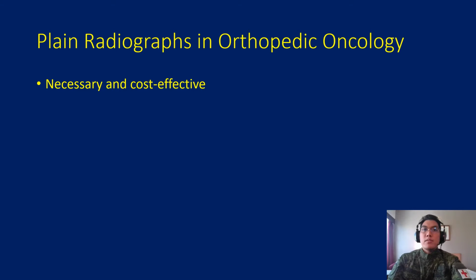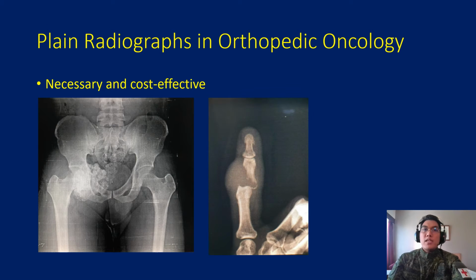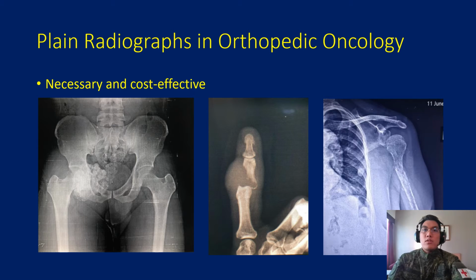Plain radiographs are the most important investigation for bone tumors. Plain radiograph is a necessary and cost-effective investigation for patients who present with a bony mass without significant pain, patients with painful bone lesions, or even patients with pathologic fractures.